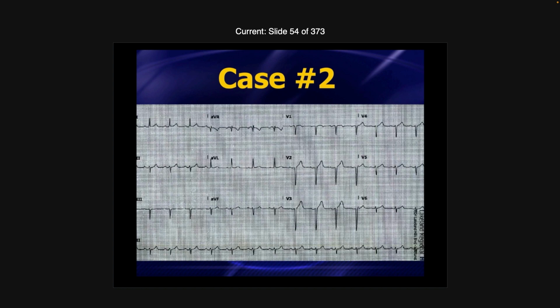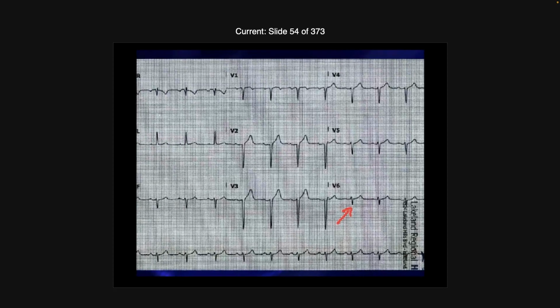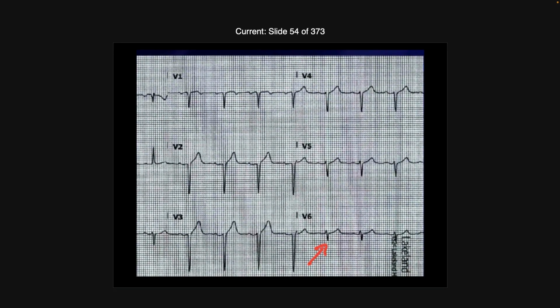Here's the initial ECG. And again, looking at this, there's nothing really jumping out at me, hopefully not jumping out at you either, unless I'm missing something that's saying this is abnormal. Now, there's maybe a larger S wave in V6 than I would expect. Maybe the leads were placed incorrectly. We've talked about very tall T waves. I don't see any T waves that are larger than the QRS complex here. So that first type of hyperacute is not seen here.